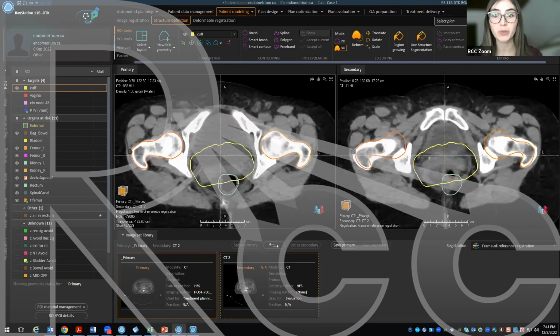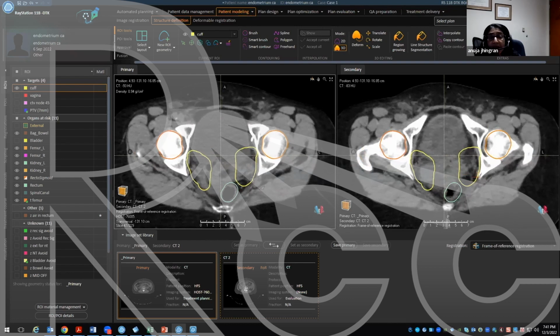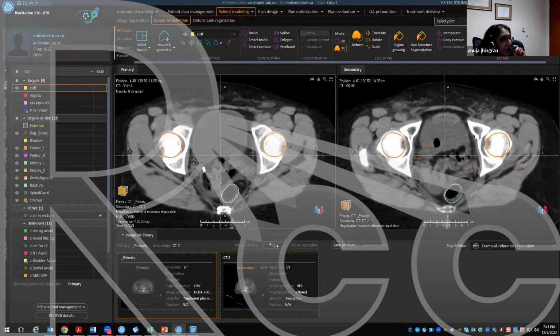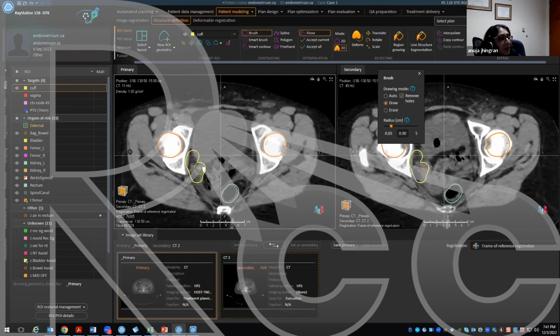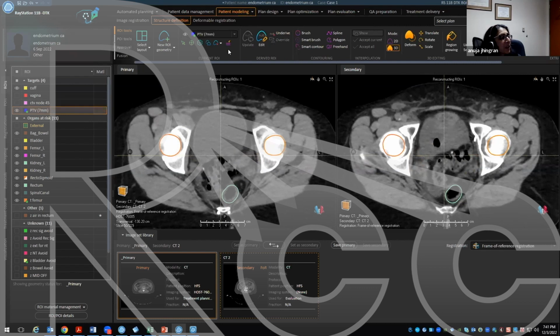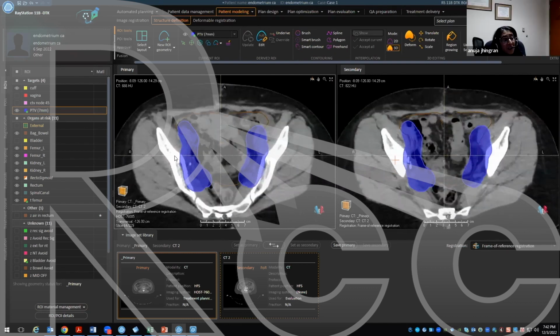What is the superior border for parametrium that you would contour? It's the same as your cervix, so it's where you see those vessels. I would either include that in my perimetrium, or include it in my nodal. It probably would have gone into my nodal. So on the next slice I would include that in my nodes, which is probably where I did include it. Questions? This is an easy one, I know. So this is my nodes right here.